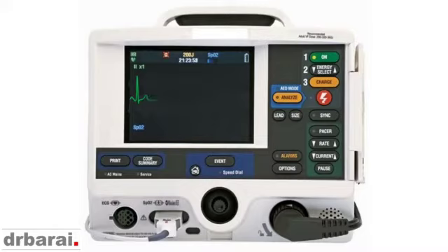Now this looks like a pretty normal ECG pattern in another patient. As you can see in this ECG pattern or rhythm, there is a P wave followed by a QRS complex. So there is a P wave followed by a narrow QRS complex, an ST segment, a T wave, and followed by another P wave, QRS complex, ST segment, and T wave. The QRS complexes are pretty regular. The PR interval is pretty constant. So it looks like this is a pretty normal sinus rhythm.